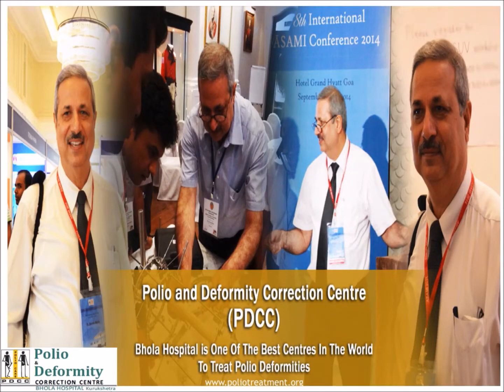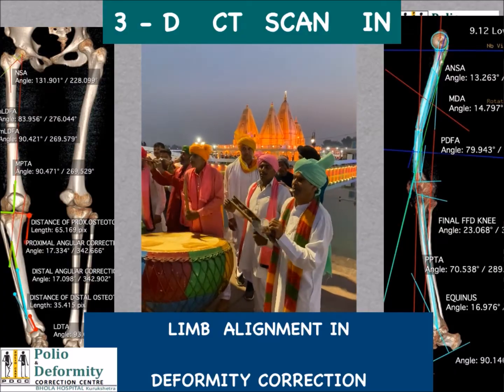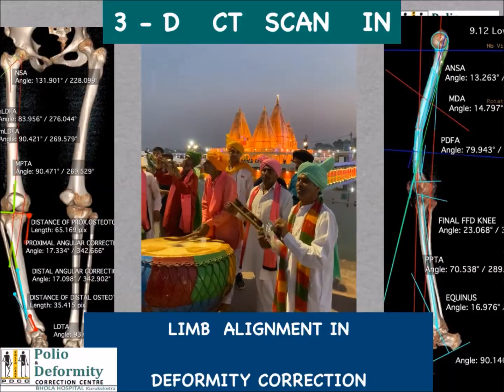Dear friends from Polio and Deformity Correction Center, I would like to share my experiences regarding 3D CT scan in limb alignment in deformity.